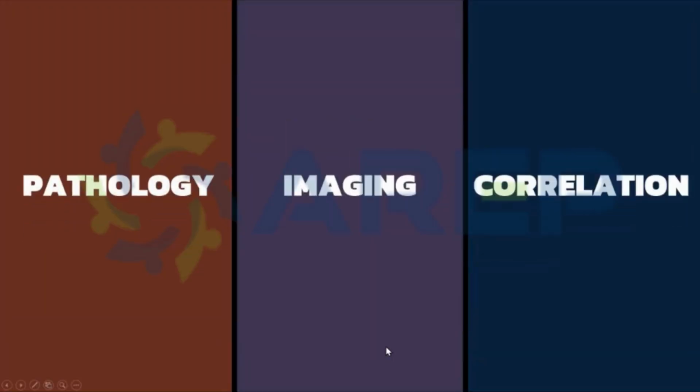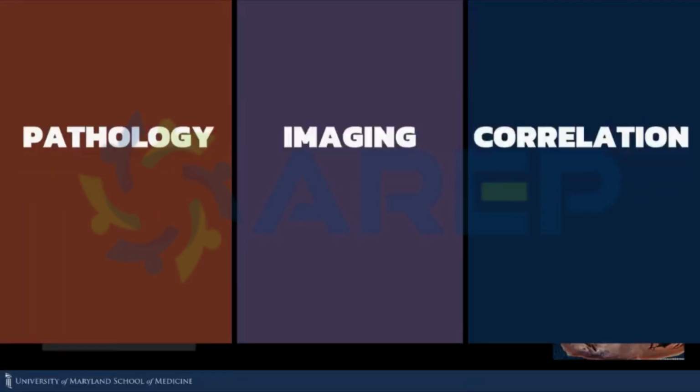So, this was pretty much a summary of the changes that we see. And I think what's most important, as MRI becomes more and more useful in evaluating cardiomyopathies, is to always have a unified approach. We understand the underlying pathology of the type of myocyte injury. We look for specific imaging parameters and features that help us prove that there is an actual underlying abnormality. And from that, we make the correlation to determine what the specific etiology is.